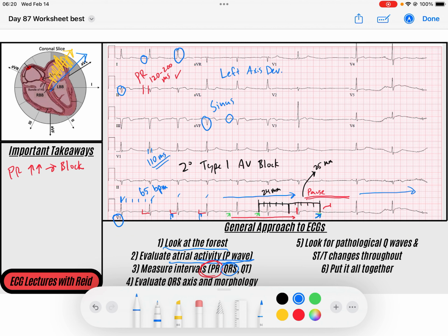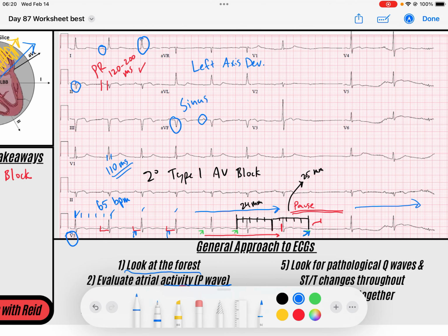Well, maybe left ventricular hypertrophy, left bundle branch blocks. And so we can kind of start to sniff out maybe what would be causing this. And what you notice here is we've also got maybe some interesting R wave progression here in V1, V2. Not so sure kind of how to think about that. It could be lead placement. I'm not really going to perseverate on that too much.